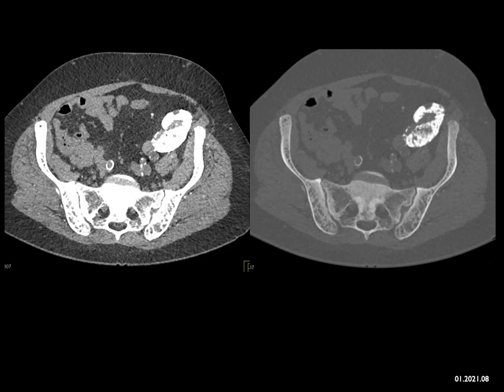Now, I'm not giving you the rest of the abdomen, which made it a bit simpler perhaps, but when you look hard, that's the shape of a kidney. And if you look at the bones, there's a mottled appearance to bone, which is a great appearance for renal osteodystrophy. So what you're really looking at is a retained, failed renal transplant with secondary renal osteodystrophy, which is answer number C. It's a great example.